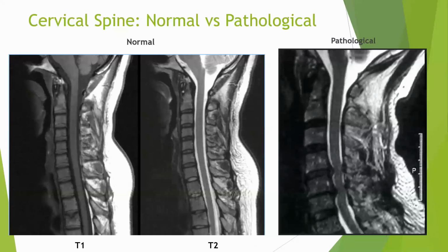Forward head posture, CT junction, there is a big hump, and that probably makes me feel that there is hypomobility of the CT junction because there is so much of fat pad. Normally, it will be a little more than above and below, but this is way too much in my opinion. Okay, again, in my opinion, it may not be in your opinion, because the interpretation is a little bit subjective, so that will be a variable.